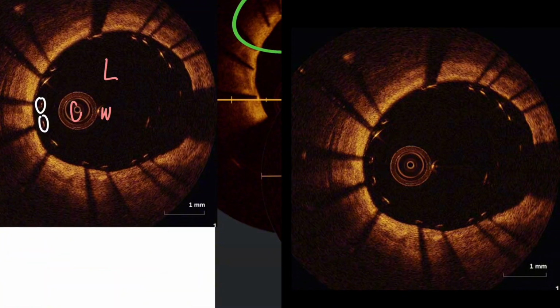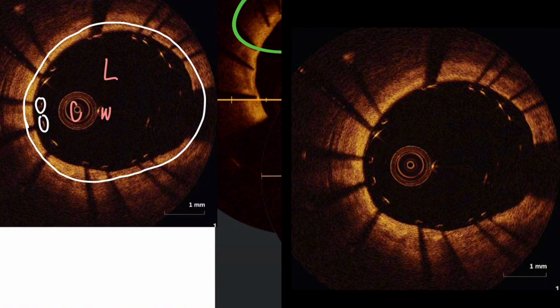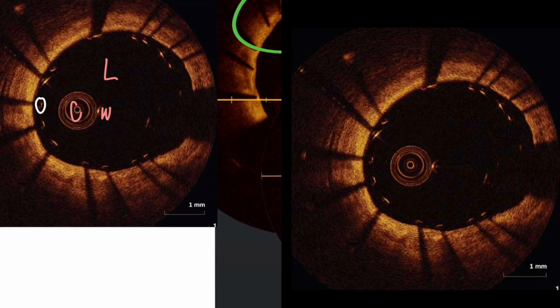Now, where's the intima? The bright yellow, that's not white. And then the media. I can kind of see the yellow here changes to something different, so I would say maybe the media is out here, kind of where that intima ends. Now, what am I thinking about this stent? Where should the stent struts be? Up against the yellow, like this one. This one's a great example.